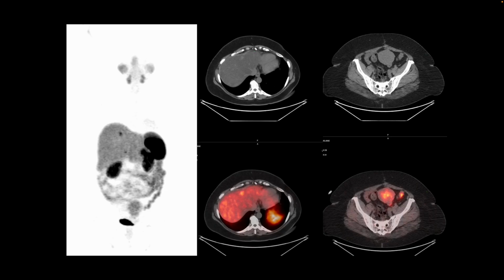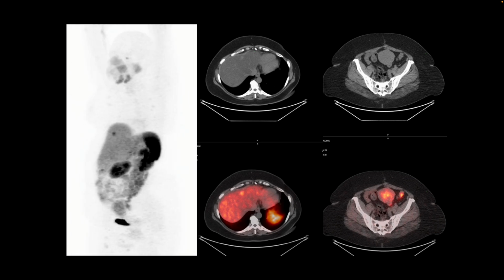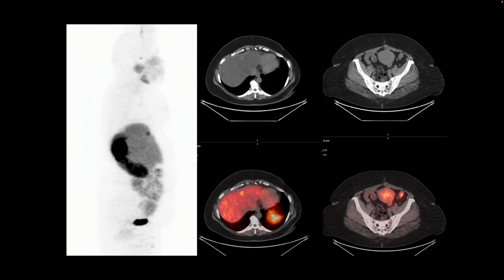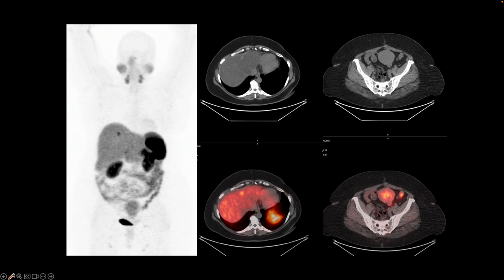Here is our next patient, and we have performed a dotatate PET CT to evaluate their neuroendocrine tumor. And we will start by reviewing their rotating image. We know that they have neuroendocrine tumor, and we know that they have metastasis to the liver, where we see a focus of increased uptake. And that finding is seen right here. We see physiologic uptake in the pituitary, salivary glands, uptake in the spleen more intense than the liver, and excretion from the kidneys into the urinary bladder.